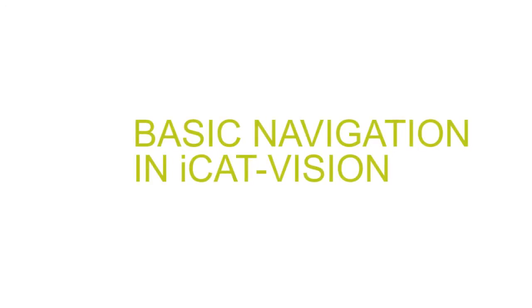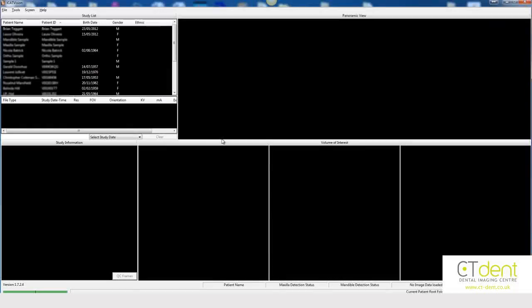This video will guide you through the interactive screens available in the iCat Vision software. When the software is opened, the preview screen will be shown. This is divided into boxes. Shown in the top left-hand box will be the names of the patients whose data have been stored in the software. When you find your patient's name, click on it.